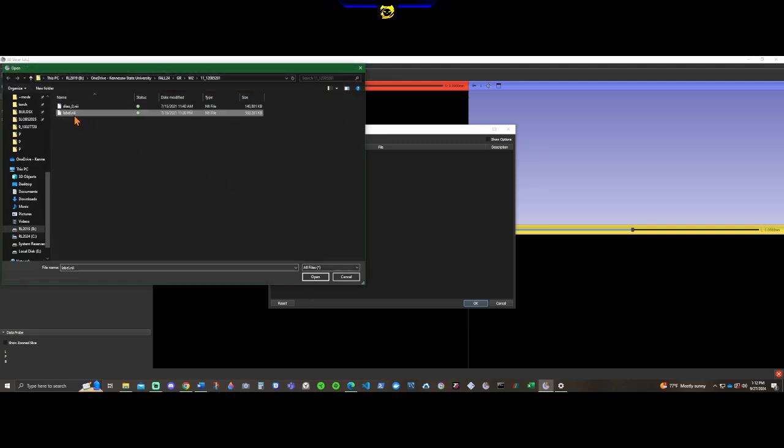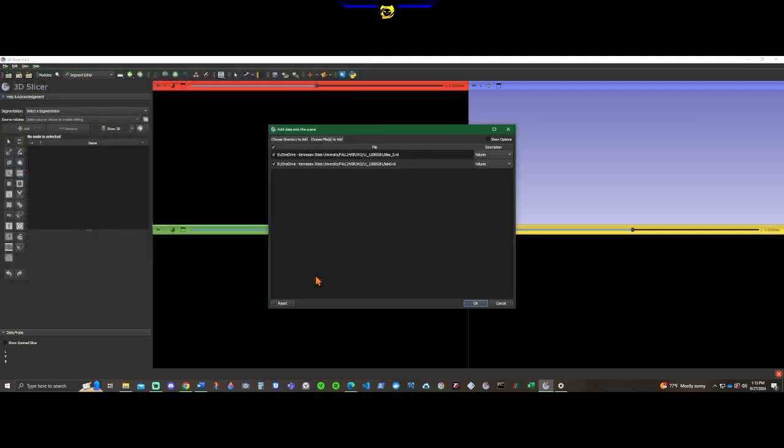So I've already put them in a separate folder, and I labeled it as 11 with the number itself because it's faster to label it as 11 compared to the 1208 5281 and remembering those numbers. So I'll just be using 11 to keep track of how many I've done and so on and so forth. But without further ado, you pull them both in.